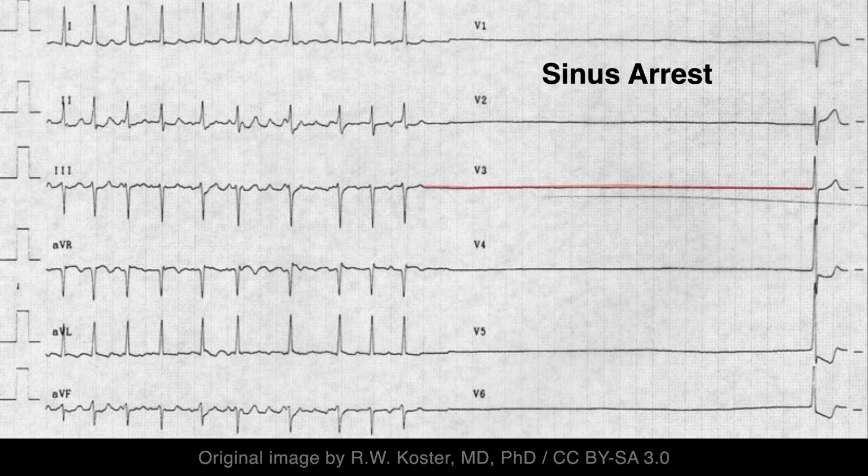Following the abrupt cessation of tachycardia, in this example, is a sinus arrest, defined as a transient absence of P waves for 2 seconds in duration or greater. The tachycardic component may also be followed by a sinus pause, escape rhythm, or asystole.